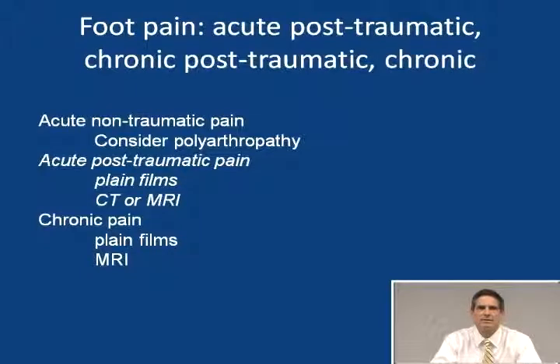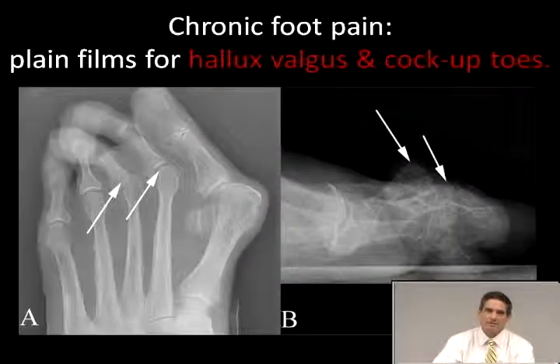All right, what about chronic foot pain? Well, the podiatrist, you'll have a lot of films like this to look at if you're associated with any clinic that has a podiatrist in it, because they're taking films all the time to assess hallux valgus and cock-up toe deformities. The degree of subluxation, the degree of secondary degenerative change, the degree of deformity, whether to surgically intervene, what the things look like after the surgical intervention. These are the things that you're going to see a lot of.